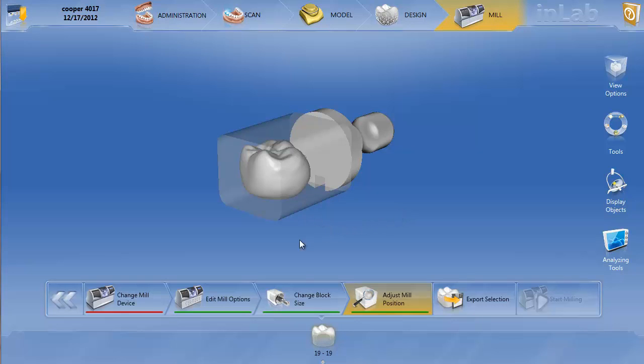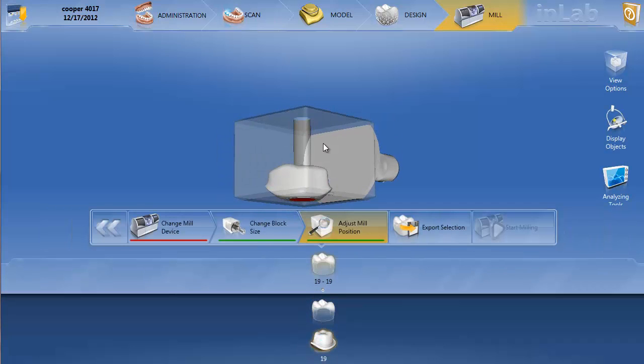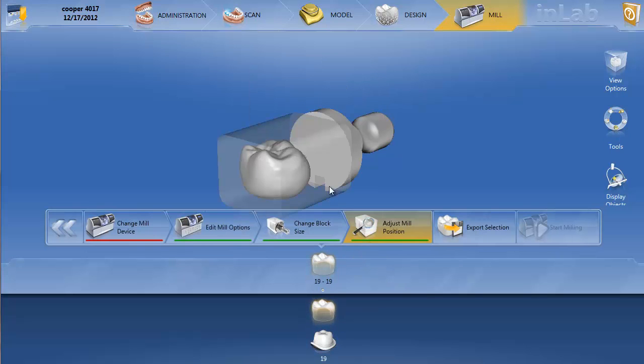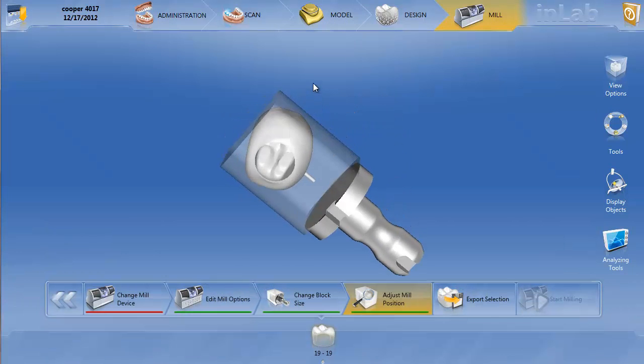Okay, well here's a case on an abutment on tooth number 19, and the dentist said when he split this crown into the abutment and the crown, he sent the abutment to Infinident, which is this file right here, got the abutment milled. When he got it back, he went to mill the crown over the top, the abutment crown, and he realized a very important thing, that it wasn't reduced correctly.